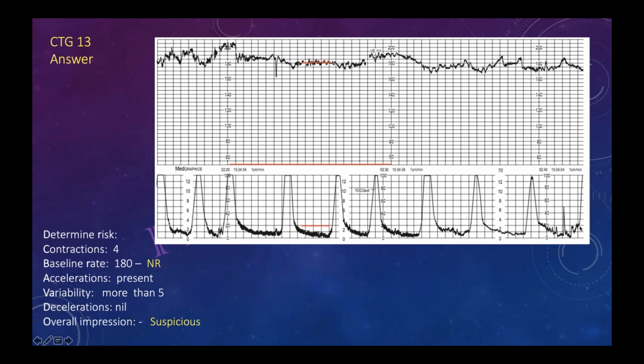This tachycardia could be. Okay, so here, this is 10 minutes from here to here. So contractions are 1, 2, 3, and 4. Whenever we calculate baseline, we take a part of CTG where no contraction is there. So this is the place where there is no contraction. Exactly the same we will take above. So here, see, it will come as 180.